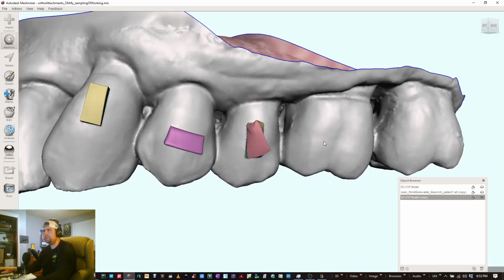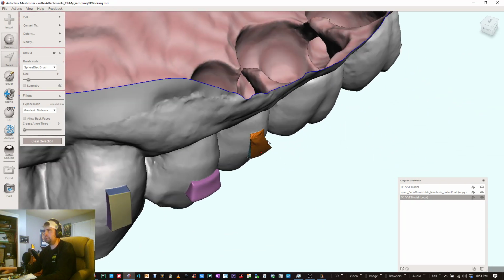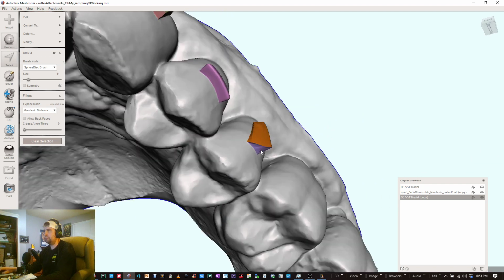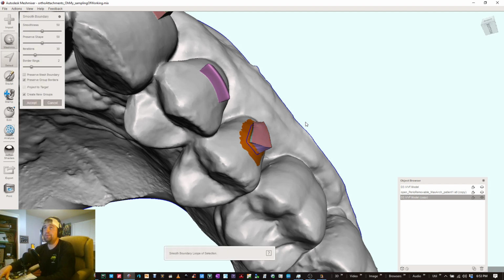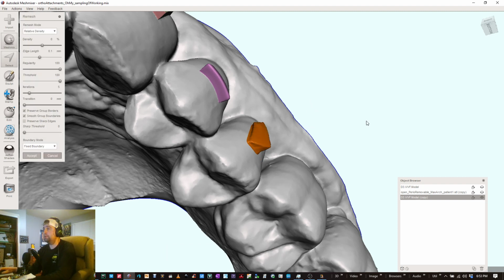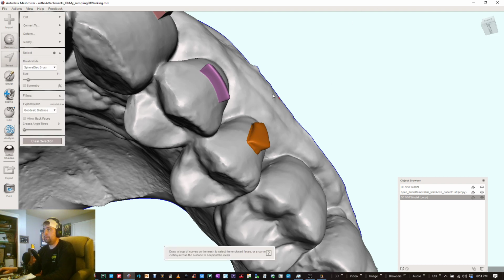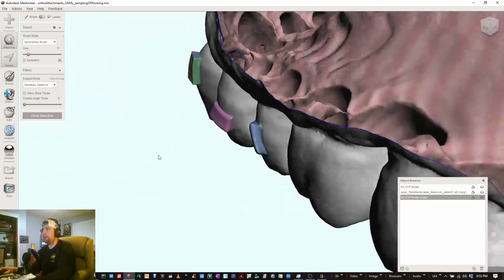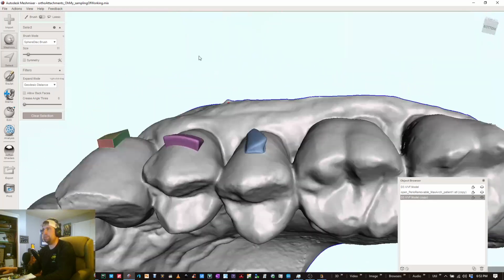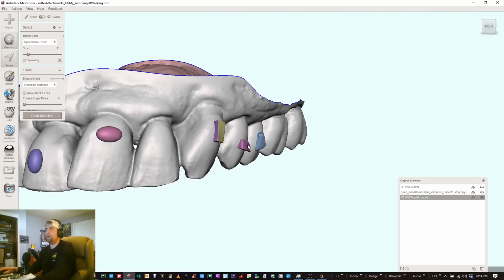And then, I guess, if you really wanted to, you could select these surfaces. I'm going to expand it by like one ring, optimize, smooth the border of that selection. I'm going to remesh, relative, smooth. That looks a little bit less insane. That's all there is to it, though. Okay, so there you go.